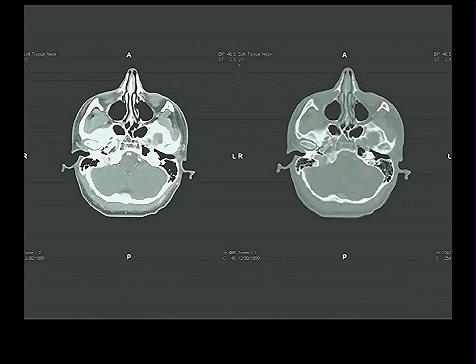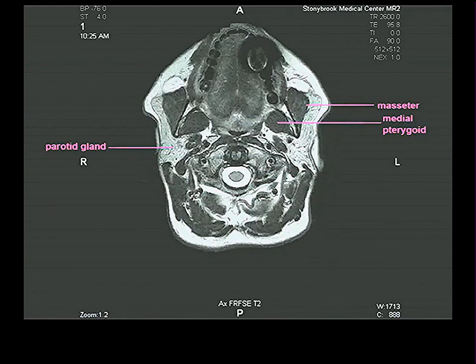All right. So if you're really interested in bone, you will change your settings so that all the soft tissue stuff doesn't obscure the things you're looking for. And now we can go into, this is going to be a nice short lecture, I think.